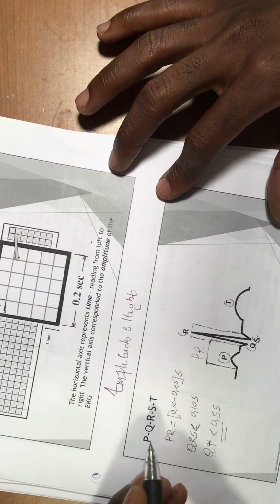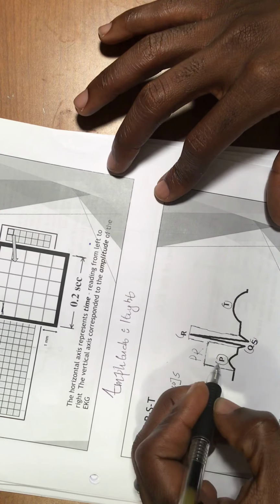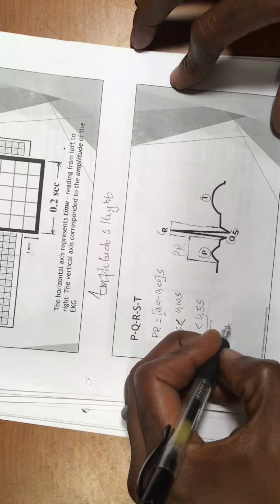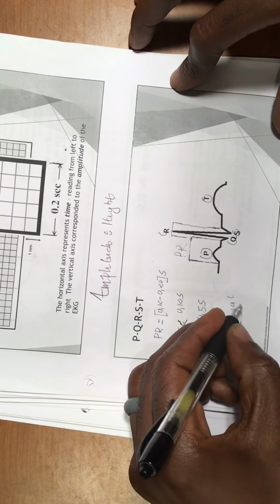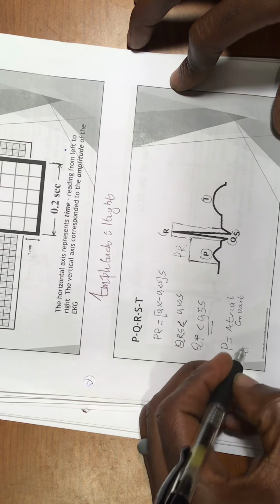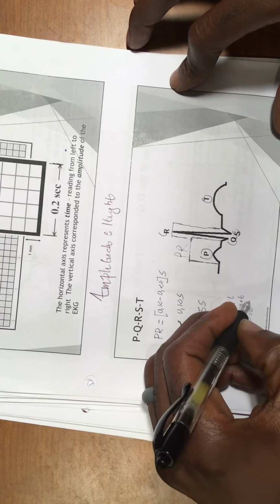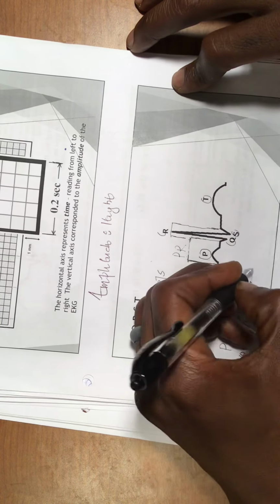So this is what we were talking about, and I remind you again. Just know that you have a PR interval and you have the P wave, and this P wave right here, if I can show you really well, means you have atrial contraction, or atrial depolarization, and the QRS right here means that you have ventricular depolarization.